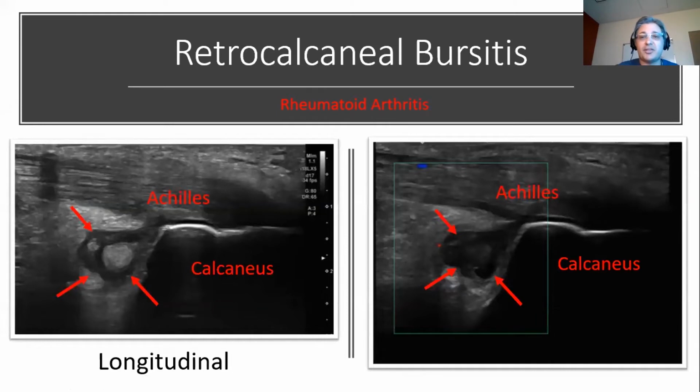What does it look like sonographically? Now that we have a high-level understanding of where this bursa lives based on MRI, let's drill down to the ultrasound, right where you expect to see this bursa. On MRI, we see it in the same location sonographically.